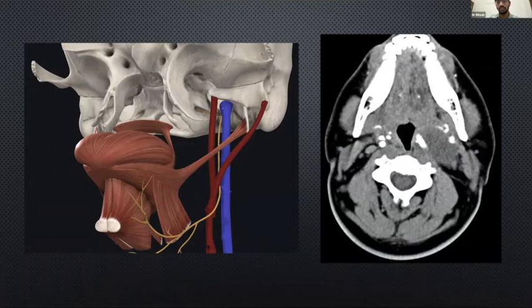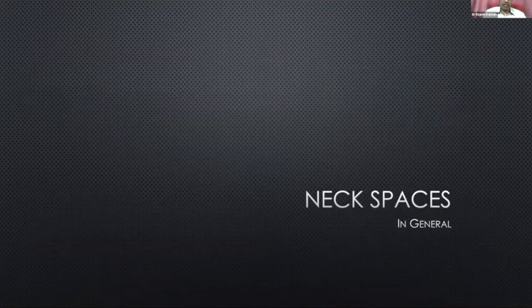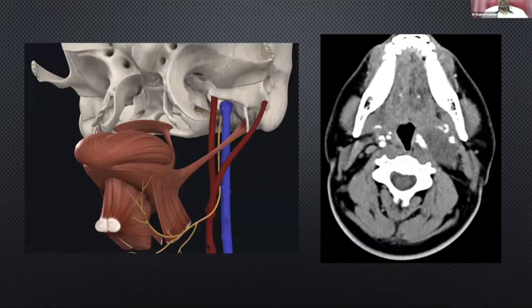Can this be a nodal mass? Why not a lymph node mass? Yes, a nodal mass is still a possibility, sir. Now, what is against it, or what is unusual? Generally, with a nodal mass you will see some conglomerate nodes, or at least some enhancement with central necrotic areas. The other thing is the shape of the lesion. This lesion is somewhat oblong, whereas a nodal mass won't have this type of shape. And we are not seeing any other primary mass also.